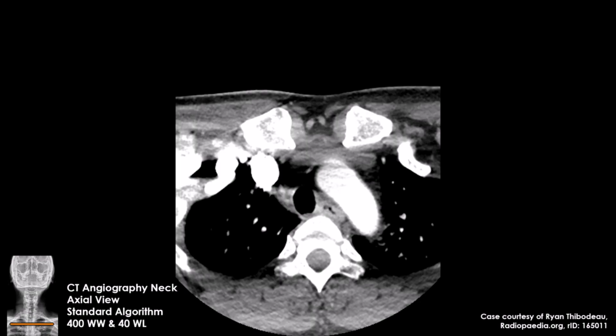First, notice this ultra-bright structure. It's the superior vena cava. It's so bright because contrast is being injected through the patient's right arm. This contrast is dumping into the heart through the superior vena cava. It's still very dense and not very diluted in the patient's blood. In fact, it's so dense at this point that we can see black streaking artifacts around the superior vena cava called beam hardening.